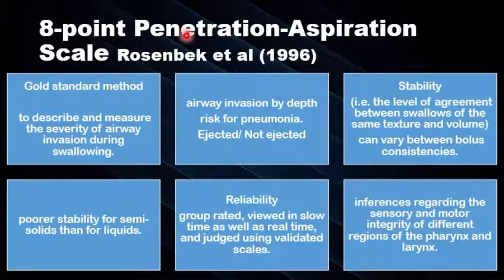The penetration aspiration scale was proposed by Rosenbek and his colleagues in 1996 and remains the gold standard method of quantification of aspiration using videofluoroscopy. It's an 8-point scaling system to quantify the severity of aspiration according to the depth of invasion of the aspirate material in the airway, whether it is in the supraglottis, the glottic levels, subglottic, or the trachea, and whether the aspirate material is ejected promptly from the airway or it remains there.